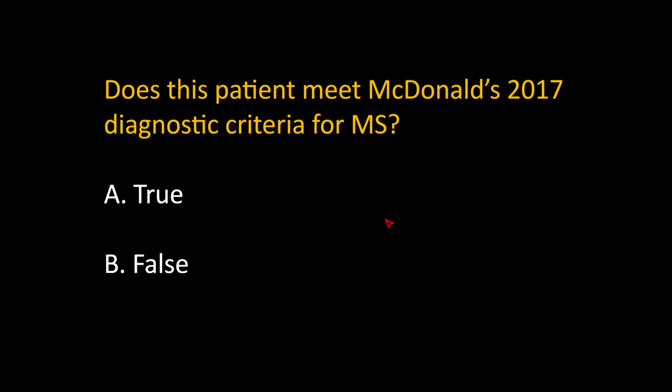So now the only thing is, does the patient meet diagnostic criteria for MS, meaning the clinical aspect? And the clinical aspect, I mean, we're not usually involved with, but this patient presented with new focal onset, focal neurologic deficits, so had an actual bona fide attack. So when you have an attack and you meet the imaging requirements for MS, you meet the diagnostic criteria for MS based on McDonald's criteria.